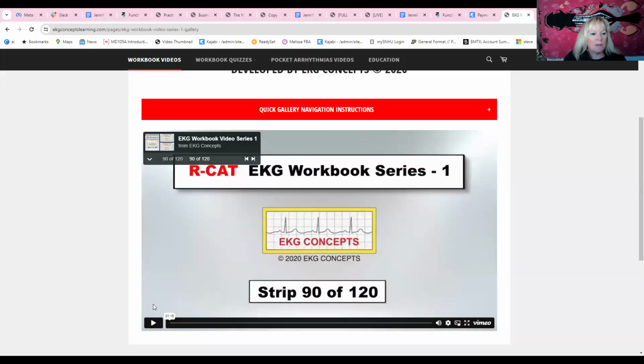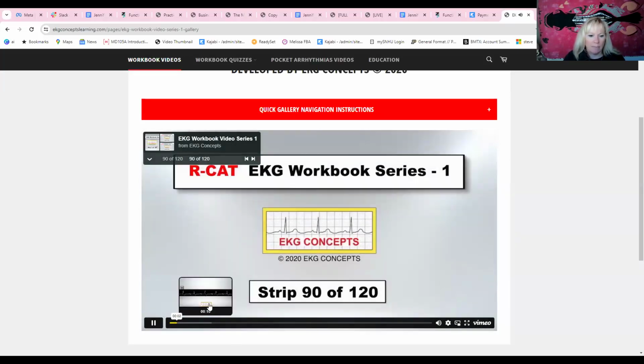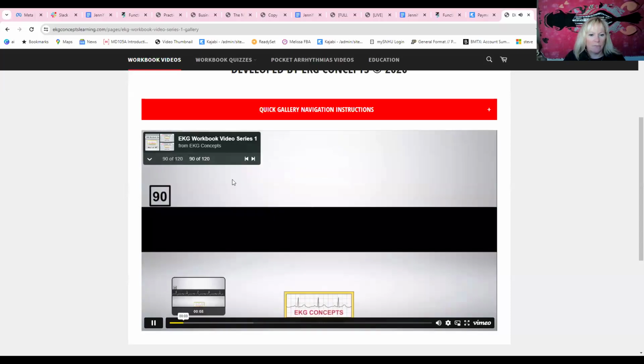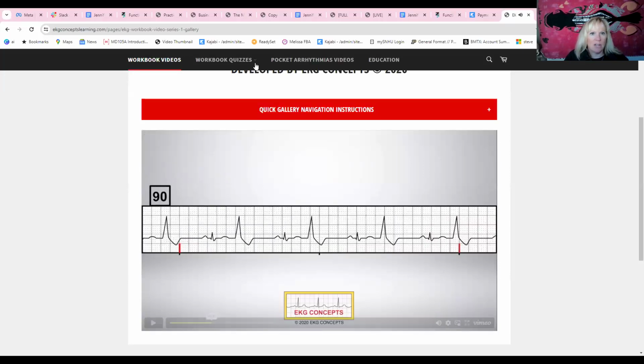We're going to do one more strip here. So let's make this one. Let's finish strong. Type in your answers when you see it. And here we go. Ooh. Got a couple things going on here. Let's see in our chat what you guys think. Okay, yeah, thank you for putting that, KJ. So pericardial, oh, I see why you're saying that.